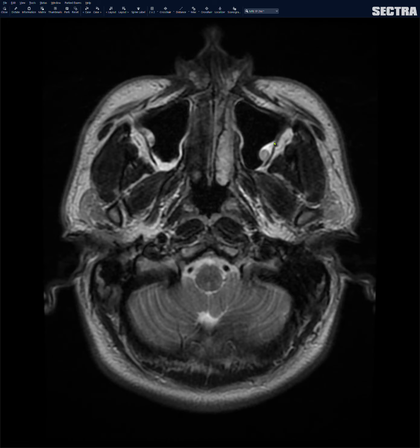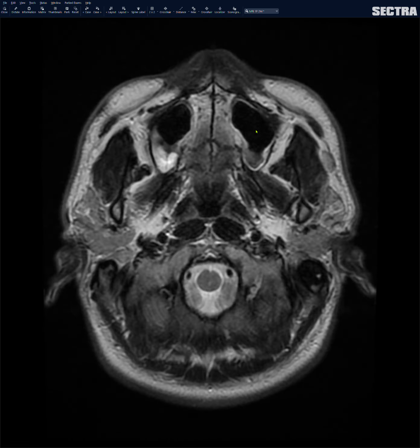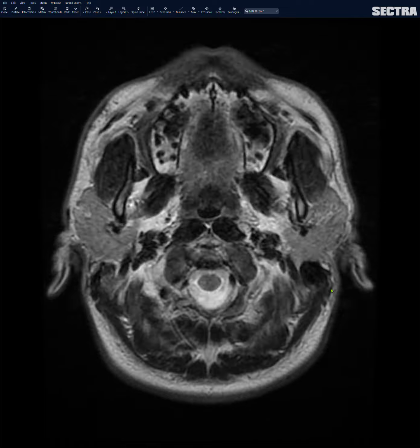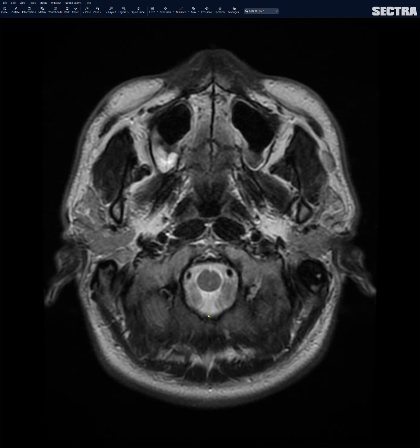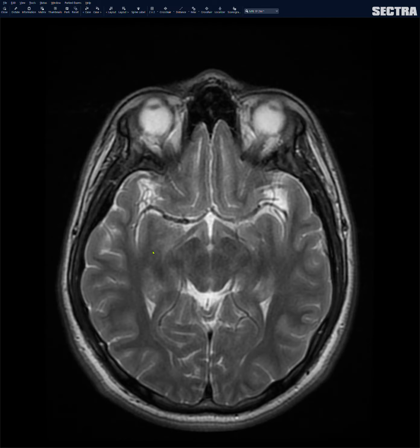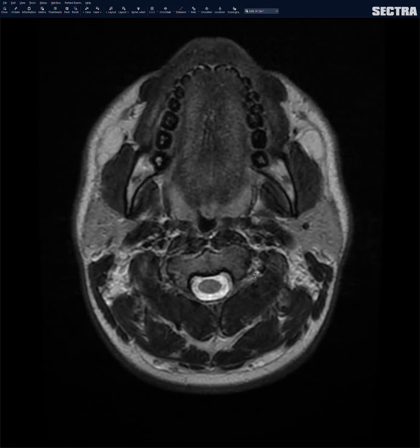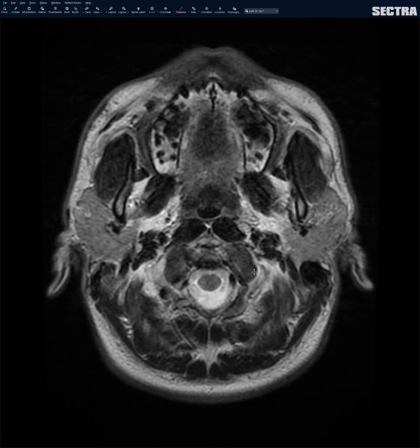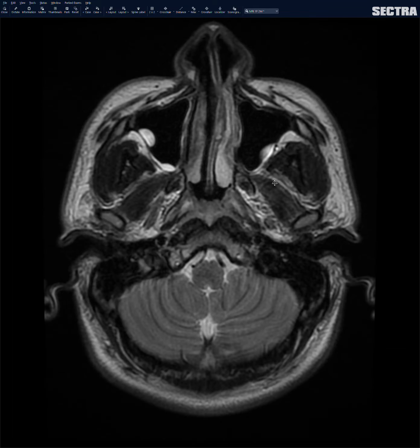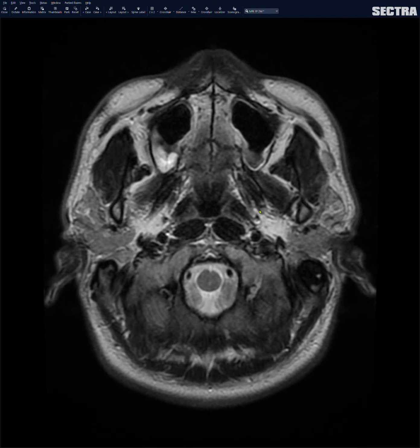So you have some trace maxillary sinus disease bilaterally. And if I look at the paranasal sinuses, I also want to look at the mastoid air cells. Check whether or not there is fluid in the mastoid air cells. Okay, and finally, I can look at some of the neck deep space soft tissues. So in this case, I can look at the masticator space here. Make sure I don't see a mass or infiltration of the postantral fat.